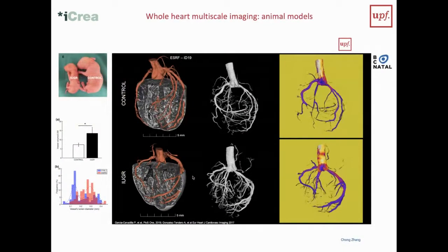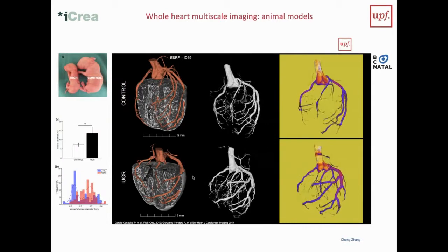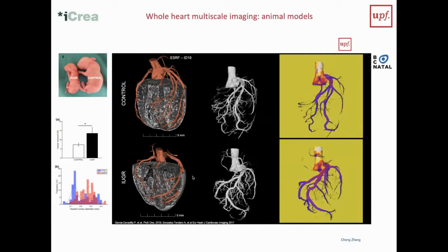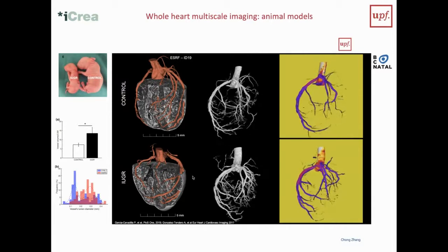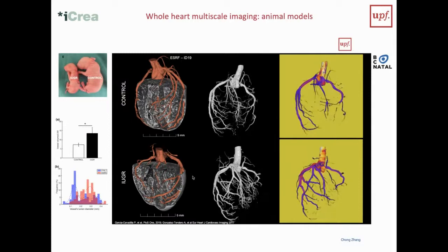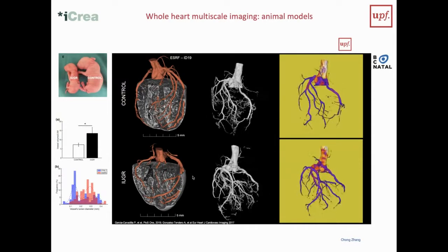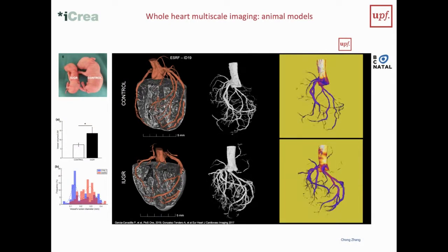This is actually a segmentation of the coronaries now without using a contrast agent. So this is the advantage again of phase contrast imaging, where we can see vessels without contrast agent. So in the future, at the moment that we can get the phase contrast effect in our CT images, we should be able to look at the vessels without contrast and look at stenosis, for example.